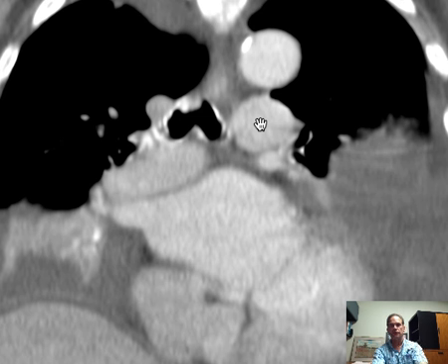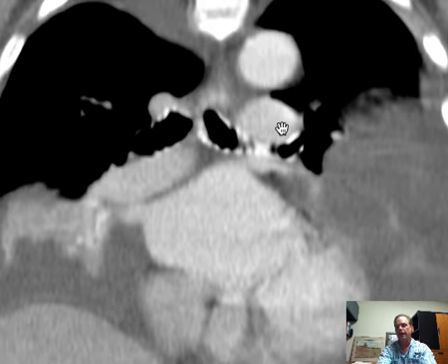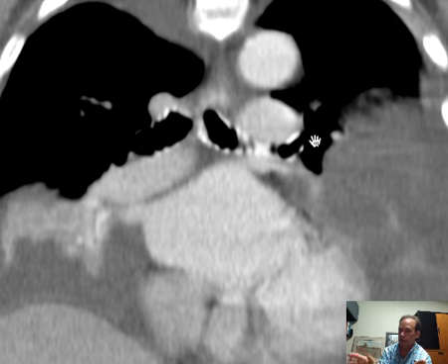Pulmonary arterial hypertension has several causes, but basically it results because something has happened to the lungs, possibly the blood vessels in the lungs, or to the lungs as a whole, and then had subsequent effects on the pulmonary arterial branches that have caused the back pressure and subsequent enlargement of the main pulmonary arteries. And you can get this with COPD, where there's destruction of lung, which then, of course, will leave you fewer and smaller pulmonary arterial branches in the lungs for all of that amount of blood to go through.